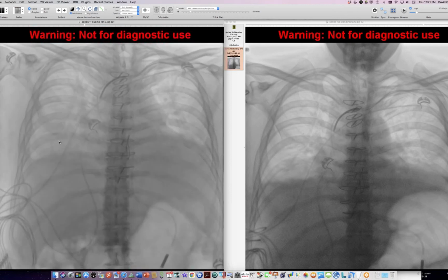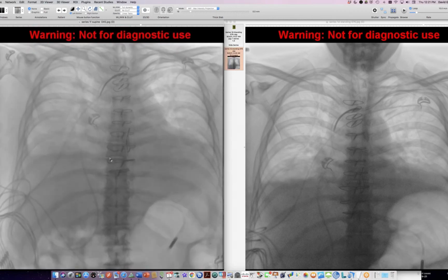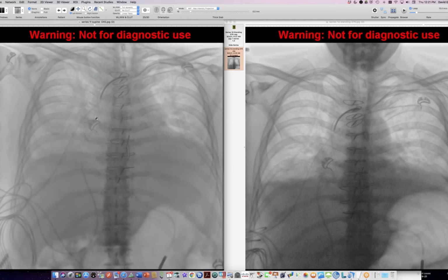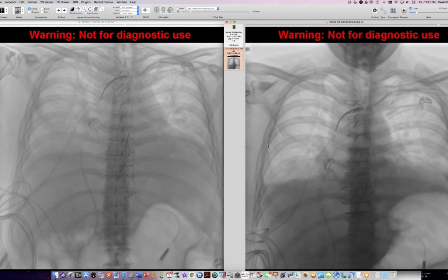There is no active motion of the right hemidiaphragm or the left hemidiaphragm here. So we have almost no excursion, and we have excursion that's actually paradoxical. The diaphragm is going up with the anterior ribs going up rather than opposing them. So this person's diaphragm is paralyzed on both sides, or at least very, very weak. So how do we explain this almost normal degree of excursion with the patient standing? And it turns out this is all abdominal breathing.